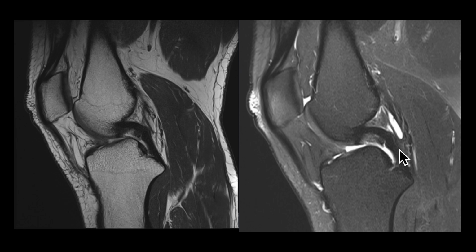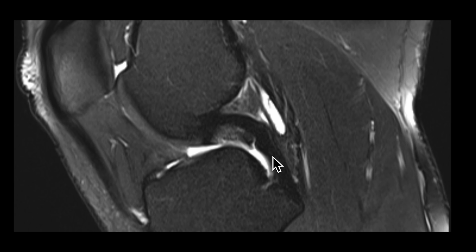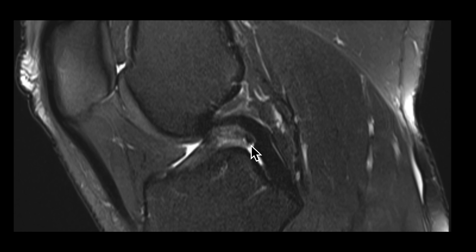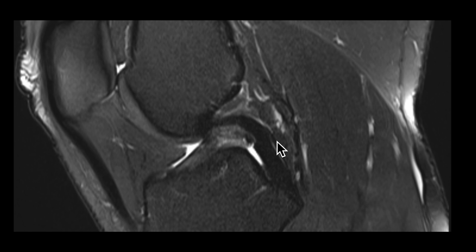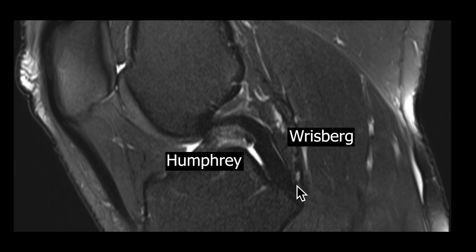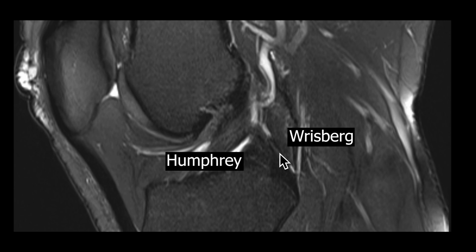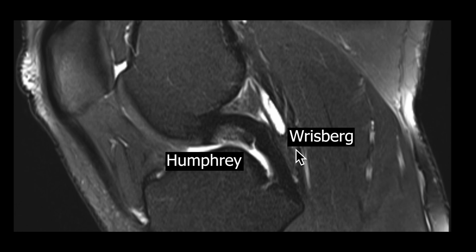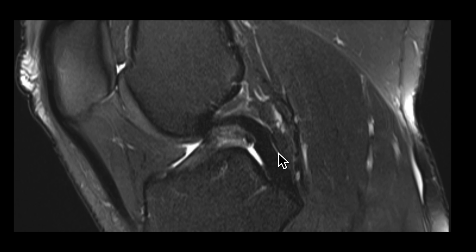In some individuals, you might see the meniscofemoral ligaments that I described before. So you can see here is a PCL which has this comma-shaped appearance, and you can see this rounded structure which is sitting anteriorly, and then you can see a more oval-shaped structure sitting posteriorly. These are the meniscofemoral ligaments. The anterior ligament is the ligament of Humphrey attaching to the femur and the posterior horn of the lateral meniscus here. And here posteriorly we have the ligament of Wrisberg, that's Wrisberg with a W, connecting the posterior horn of the lateral meniscus to the femur. And again, we just want to show you these structures and emphasize their existence because you can easily misinterpret this for a tear even though they're a normal variant.